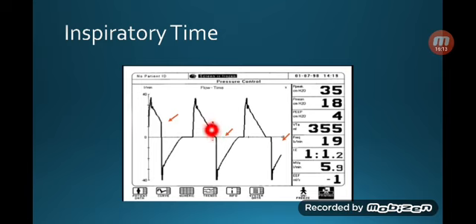It gets really cut down quickly. Here it seems appropriate because it goes back to the zero line, keeps the pressure in for some time, and then goes down. This is a safety net for you because, again, the lung status is dynamic. So at some points, this might change, and what seemed like a proper inspiratory time can be just enough.